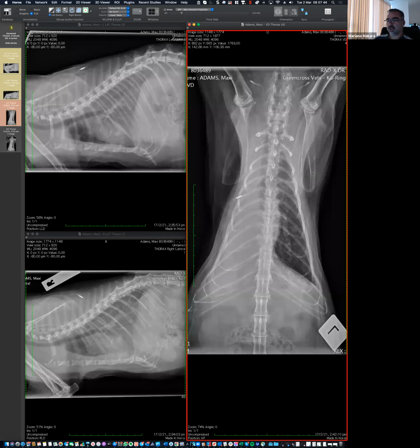But the approach is like that. There's more white in that hemithorax. It's extremely descriptive, and for now not committing. And now the next step is going to be, the question is, can we commit? Can we decide first? Is there anything else that you want to mention?